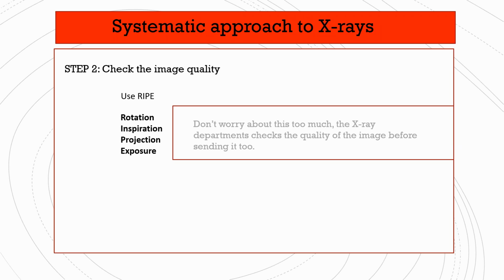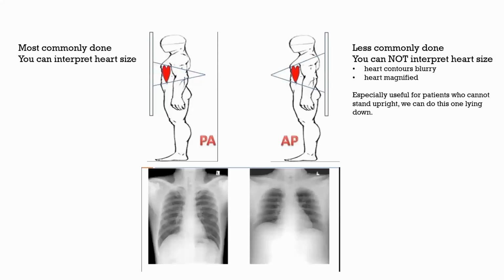So you don't have to worry about that too much, but it's worth mentioning it. I think this X-ray might be a bit rotated, so I'm not sure, mention it if you think so.